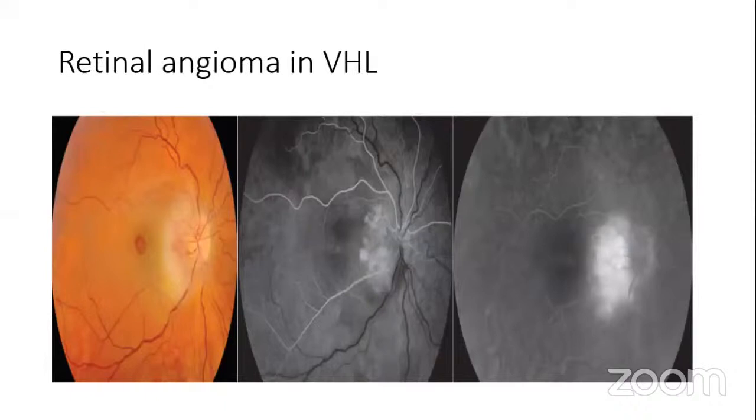Okay. Now, this picture is of a retinal angioma in a patient with von Hippel-Lindau disease. If you look at the fundus photo here, you can make out some other things: you have some form of serous detachment of the macula, and there's evidently a large hole here. But our concentration is on the vascular tumor here. So the question now would be, the tumor has its own vessels, and there's extension of the retinal vessels into the tumor as well.